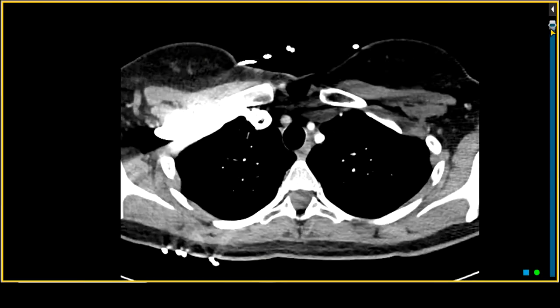So this next patient is a 29-year-old female who's pregnant and has shortness of breath, for which a CT scan of the chest utilizing a pulmonary embolism protocol was performed. So we'll scroll down through these images.